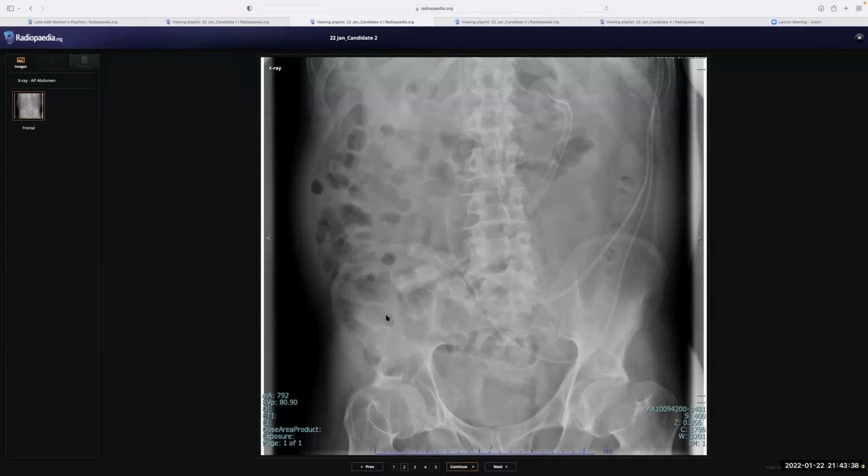I'm looking at the visualized skeleton and I can see, perhaps due to rotation or perhaps an actual asymmetry in the skeleton, a tilt. There is deformity of the femoral neck orientation bilaterally. I think this is just positional, so you can ignore it. Okay, it's positional. The patient has presented with sepsis.